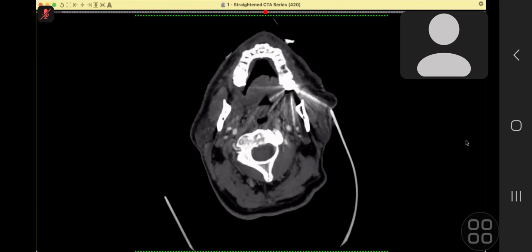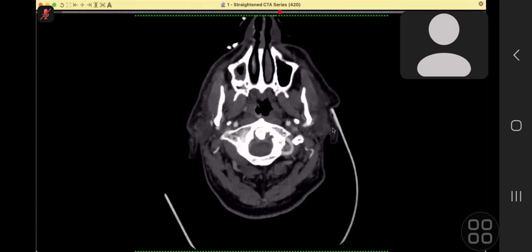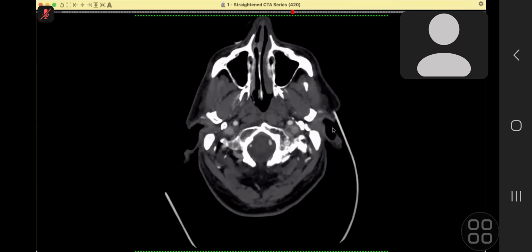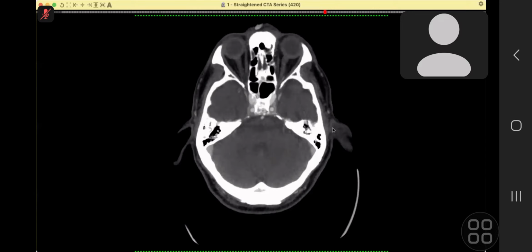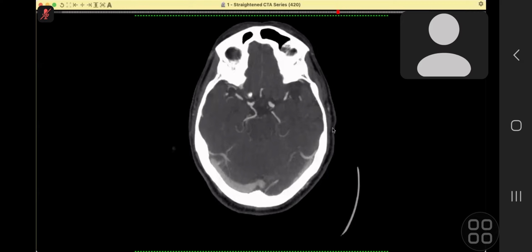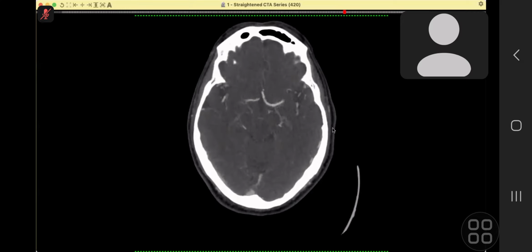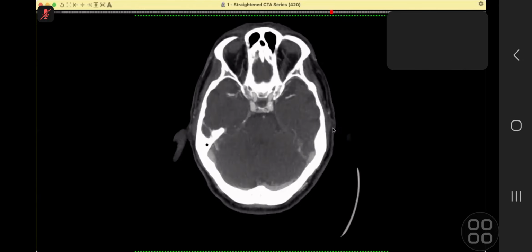Okay, in the basilar artery, I can see that there is loss of the enhancing pattern of the normal basilar artery seen proximally. This confirms the presence of a filling defect representing basilar artery thrombosis. What will you do next?